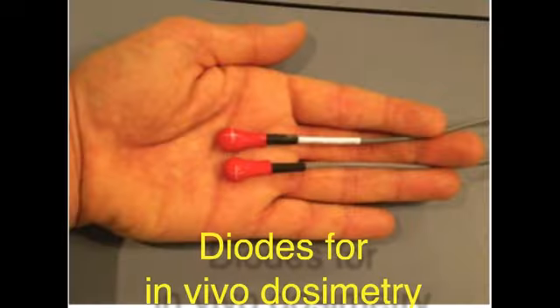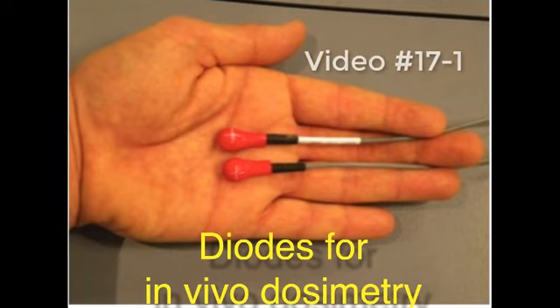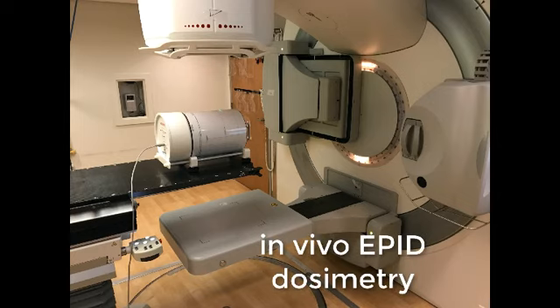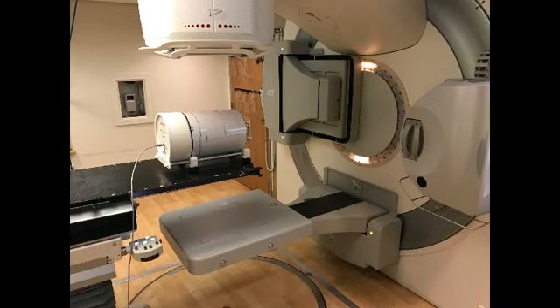You've already seen these. These are diodes for in vivo dosimetry. You can go back and look at video 17.1 to see this. The problem is these are just single point measurements, so they're not great for looking at spatial variations in an IMRT field. We talked about this. This is an EPID QA. You could do this with the patient in the beam, and that would be called in vivo EPID dosimetry. In that case, you're measuring the exit dose from the patient, and you can backtrack and figure out if it's what it should be coming through the patient.